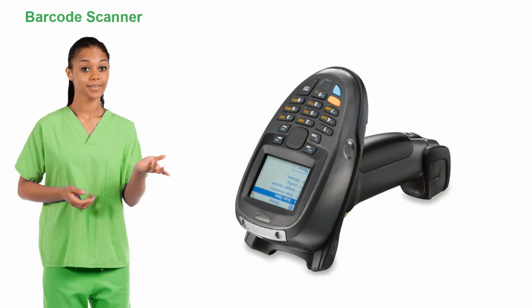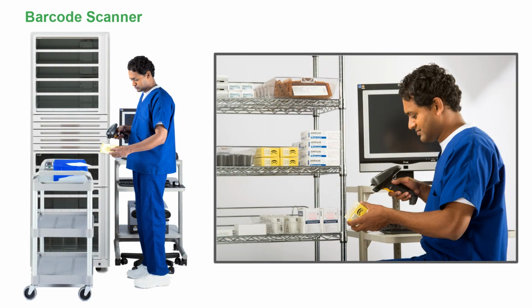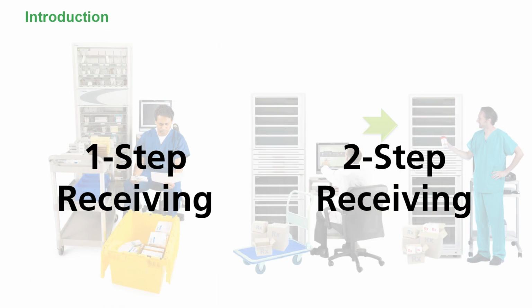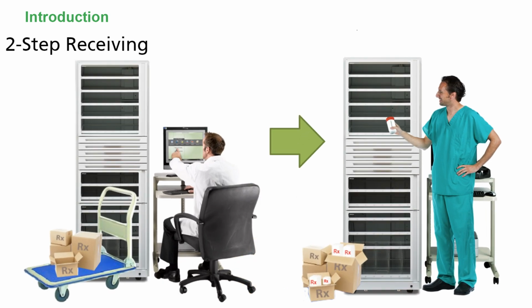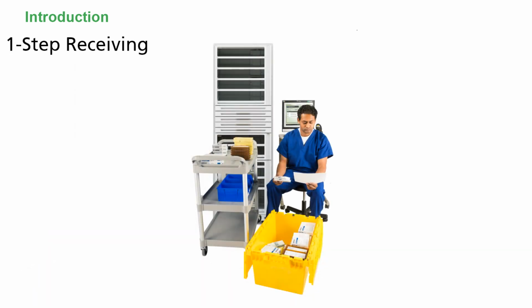Your facility may or may not use a scanner with CSM. If any CSM items are configured at OmniCenter to require issue and restock confirmation by barcode scan, the scanner use is required. CSM supports one-step and two-step methods for receiving and stocking items. In one-step receiving, the same pharmacy user receives and stocks items to CSM in a continuous process. In two-step receiving, receiving and stocking are separate processes, requiring separate permissions. For this course, we will show you both processes using one-step receiving.